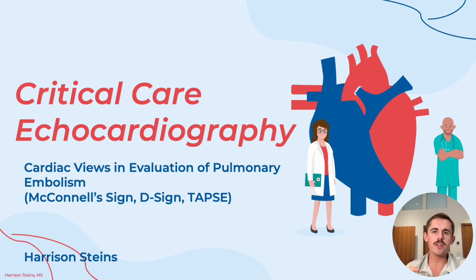as an early marker of right heart strain. So this is important because in settings where CT pulmonary angiography isn't available, say a resource-limited setting, or where your only imaging tool is a portable ultrasound, then these findings may justify some of your clinical decision making after you find them. So it may justify anticoagulation or even thrombolysis based on the clinical context of the patient and bedside ultrasound alone.